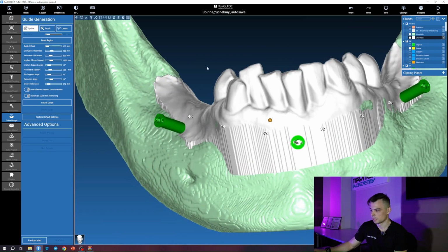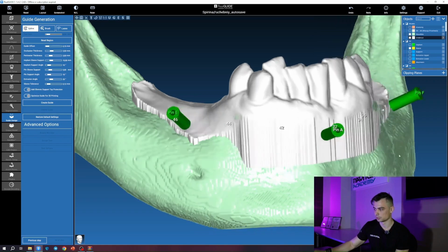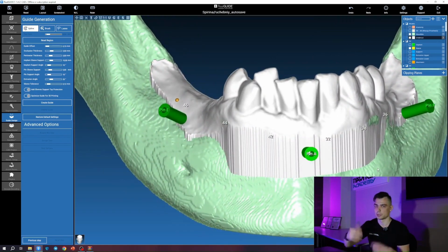And it's also important to understand that even though this template is a positioning one, meaning this template will essentially position 2 fixation pins, the surgeon will simply need to reflect the tissue and find these 2 holes at the next stage after tooth extraction, fit them, and in the 3rd surgical template, this fixation pin will be there. But let's go through everything step by step.